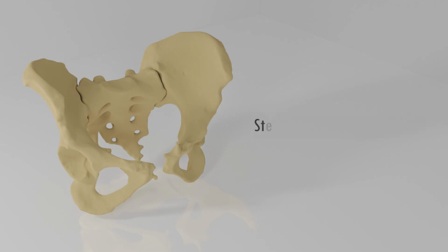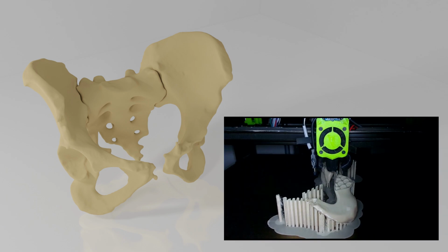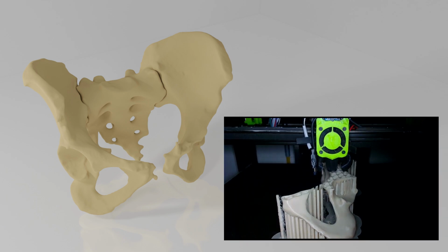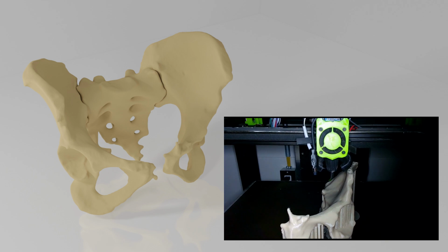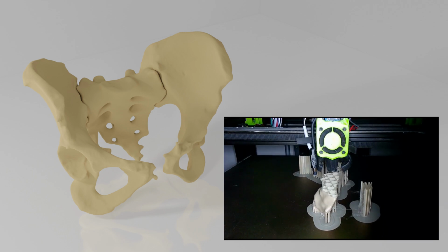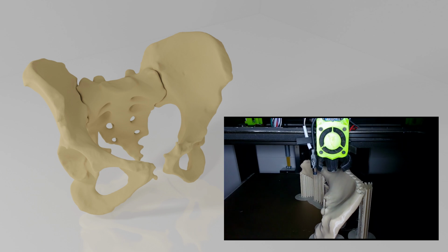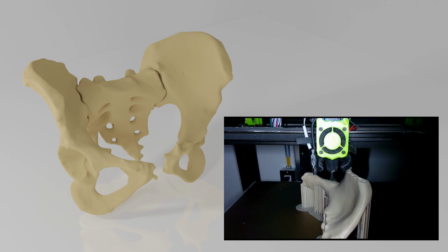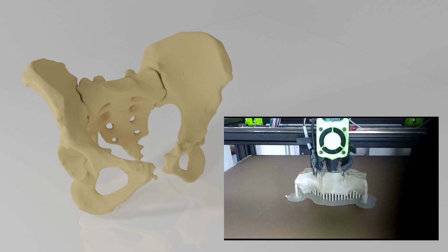With the digital model finally ready to print, we can move on to the next step, which is, of course, 3D printing. As the model represents rigid bone structures and there are no special mechanical or medical requirements to the material, we use common FDM technology. The final model consists of 5 parts: left and right hip bone, sacrum, a bolt and a nut. The total print time was about 16 hours for all parts plus 30 minutes of post-processing.